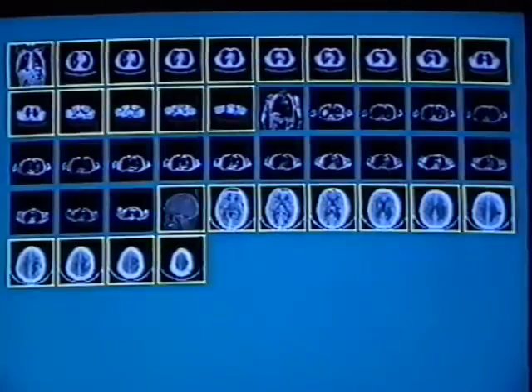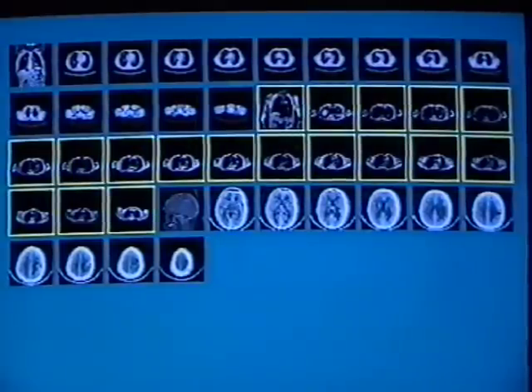Three-dimensional CT and MR series are normally visualized by means of histogram equalization. When images with bad contrast, such as verification films and port films, have to be used, a special inspection glass can be set and moved over the images in which real-time local area histogram equalization is performed.